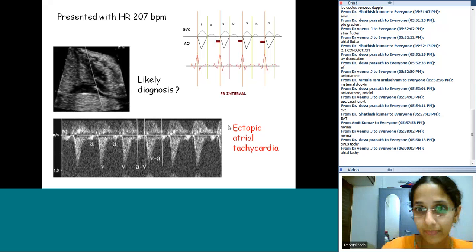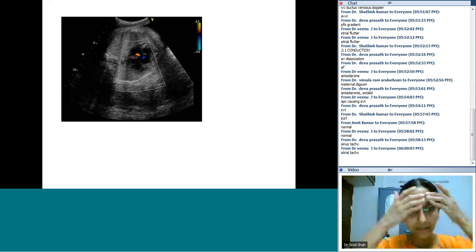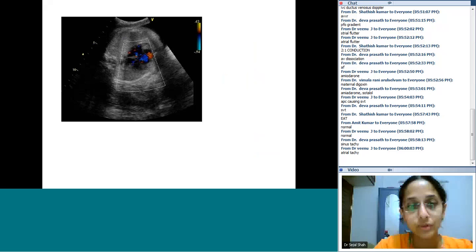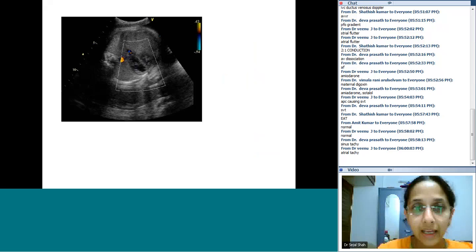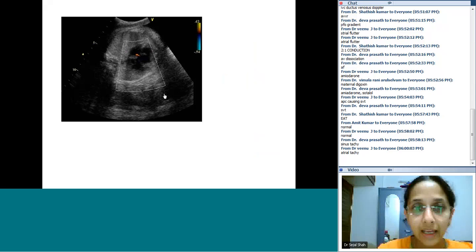Now coming down to the slides, maybe we have 2 or 3 slides now, and we can see this is the 4-chamber view. Structurally, descending aorta, left heart, right heart. This is the tricuspid valve, so it's AV concordance. Structurally, it's a normal heart. This is also just an impression based on how the heart is detailed. Can we suspect anything based on this?